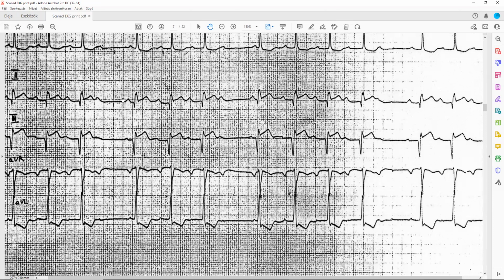If they are equal, that's Mobitz type 2. In this case, it's okay if you can see the elongation of the PR interval. However, if you have an 8 to 7 conduction, there is no way that you will see the changes of the PR interval at the beginning. So please consider that and use this phrase: last one, first one, let's compare. So that's Mobitz type 1.